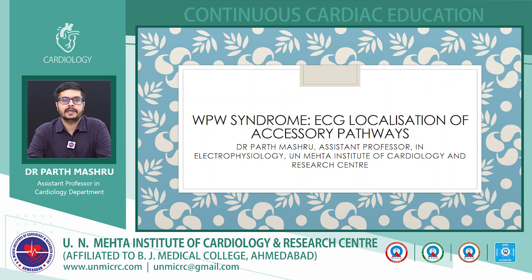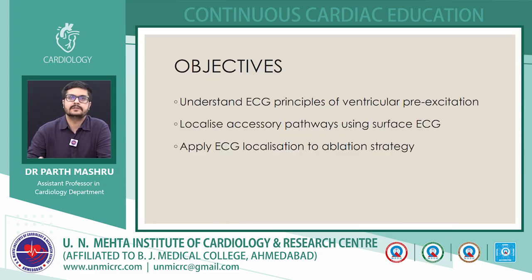And today the topic that I am going to discuss is WPW syndrome, but I will be focusing only on the ECG localization of accessory pathways, and how you can easily approach, by just looking at the ECG, where exactly the accessory pathways are and what their importance is.